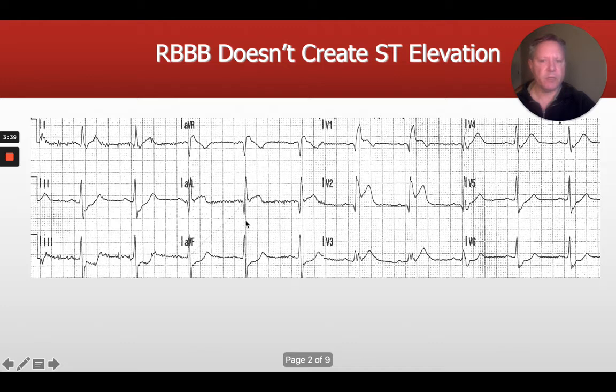So we just have it in just the one lead. We can also see that there's ST elevation up here in V1. There's the junction right there. And also right here, there's the junction. So there's ST elevation in V1 and V2. This one just has kind of a tall T wave, but from the junction point, it looks pretty isoelectric.